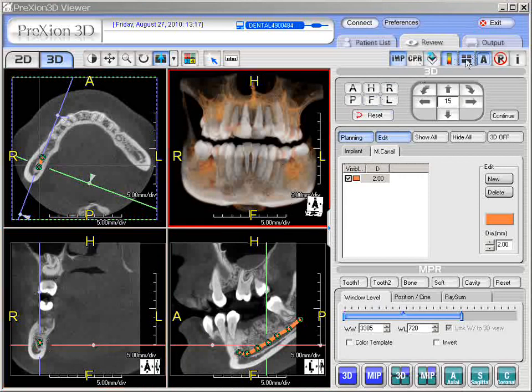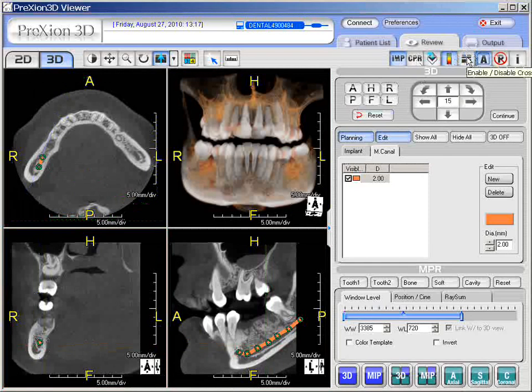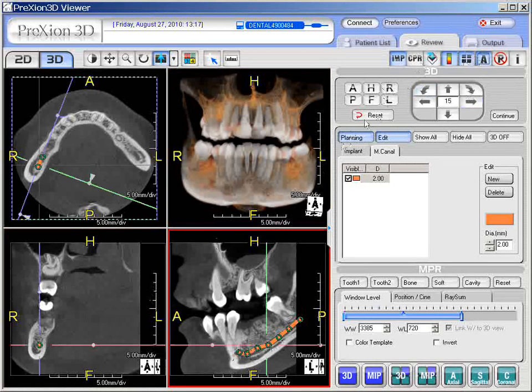These crossbars can be taken off. These four black squares up here, just click that. That's a toggle switch to take these off and on, in case you want to see this a little bit clearer. So if you want to go from the other screens, just click on the green circle, drag it back into the position that you wish. Or you can do this from the longitudinal screen, just whatever screen you wish to do. Okay? And then you can continue with slicing. Now put the lines back on.